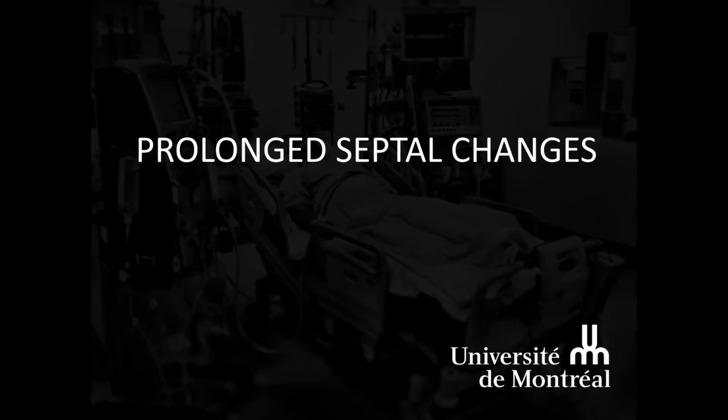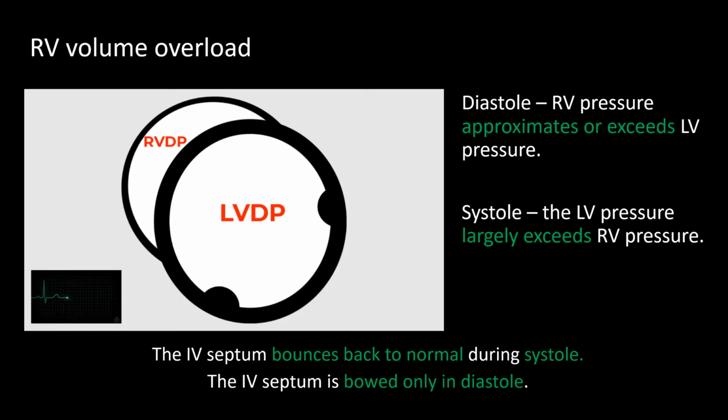The first step for me is to identify if the septal change is prolonged during the cardiac cycle. Prolonged in this case means having a septal abnormality that stays uninterrupted during a portion of the cardiac cycle. This may be a significant portion of systole or diastole. The first of those pathologies is RV volume overload, typical of isolated tricuspid regurgitation.